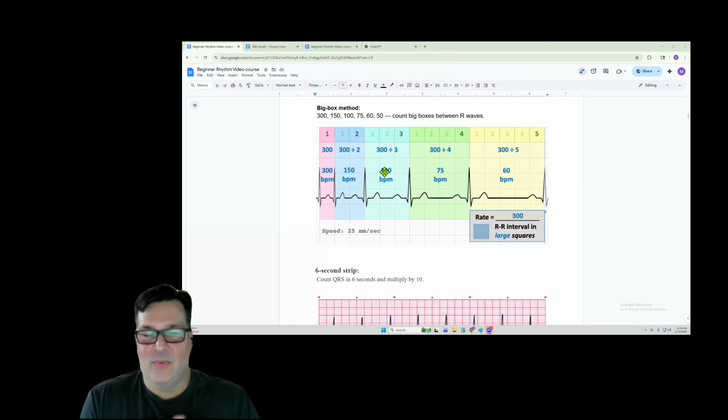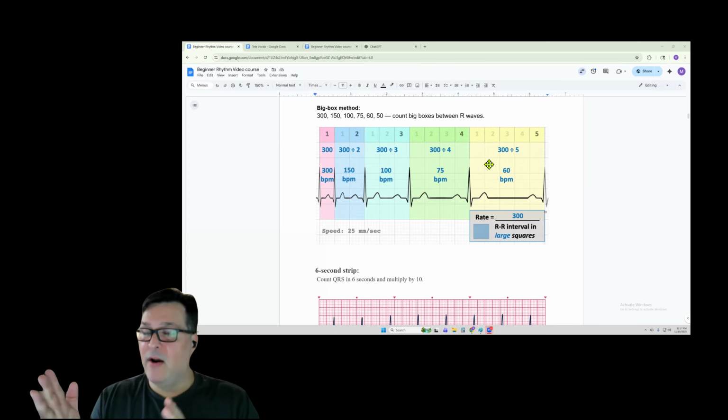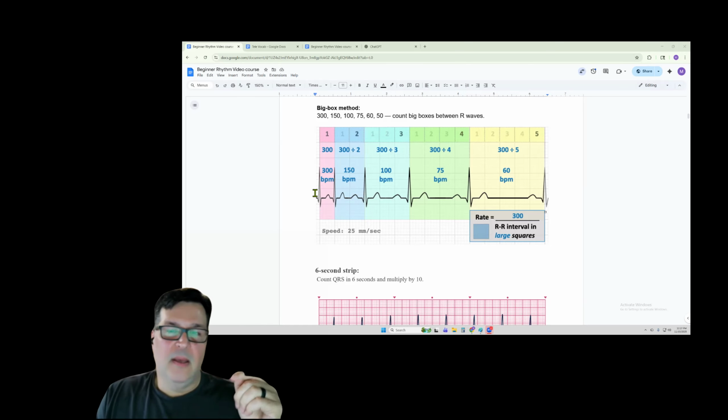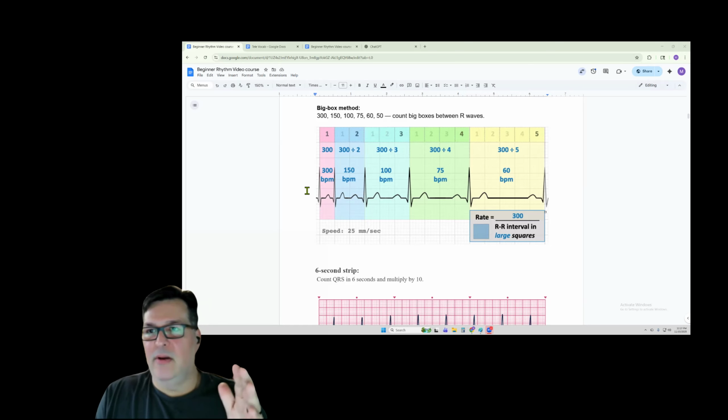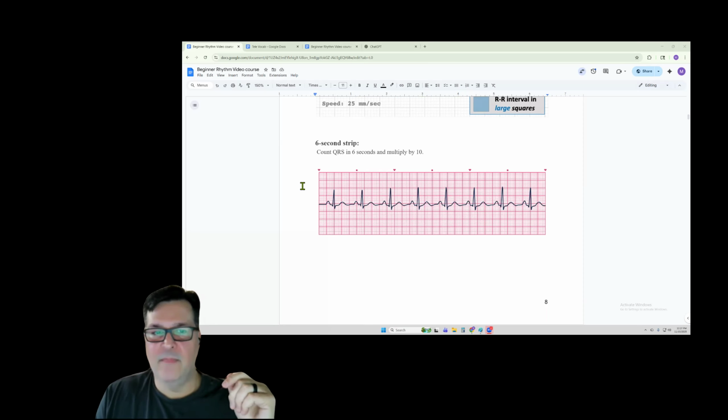Yeah. And that's why I like this particular one, because first of all, it's quick, and then it equates to flutter, like you said. This measurement here is that the rhythm is regular, when the R to R is very regular. And nobody's perfectly 60 all the time. There's heart rate variation, 60, 63, 64, like nobody's perfect, but it's pretty close. When you have something totally irregular like AFib, you can do a 6-second counting strip.